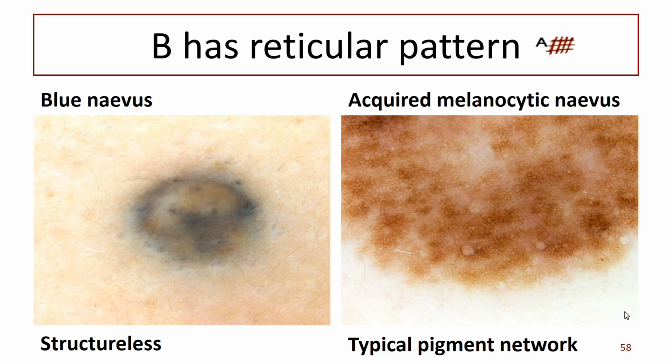So this one is a blue nevus. Does anyone notice anything funny about this blue nevus? This blue nevus? It's yellow. Yes. Emily, do you know why blue nevi are sometimes yellow?